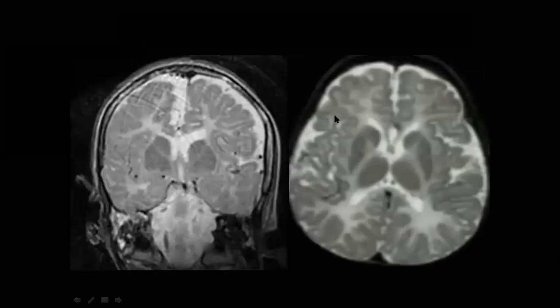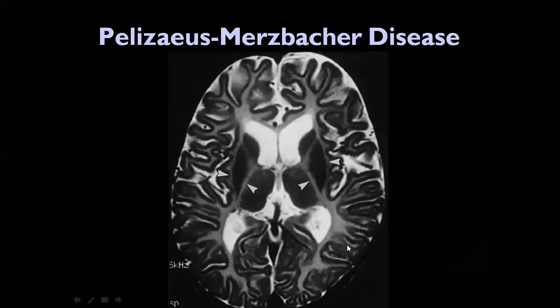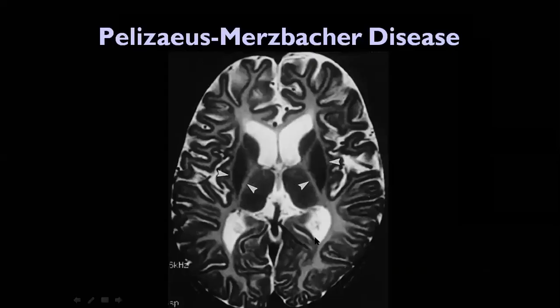Okay, and something in the skin. Another case that comes in the pediatric age group, it can be like a differential. You will put one of the differentials that happen in the gray matter, in the white matter. So you are thinking of white matter disease, which happens in the pediatric age group. One of them will be this syndrome. Sure, that is not a spot diagnosis or an anatomy case. You just need to put a differential, some differential of white matter disease coming in the pediatric age group.